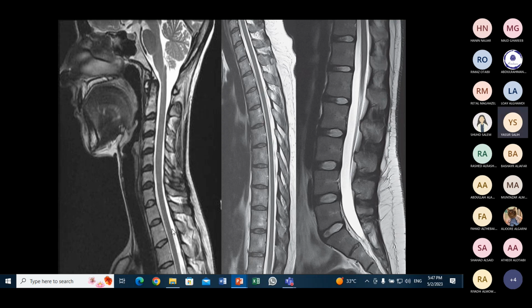Which sequence is this one? ايش السيكونس دي؟ What sequences do you know? ايش يعني sequencing؟ MRI sequences زي ما قلنا هي T1, T2, FLAIR, diffusion weighted image. في many sequences here. For which one is this?